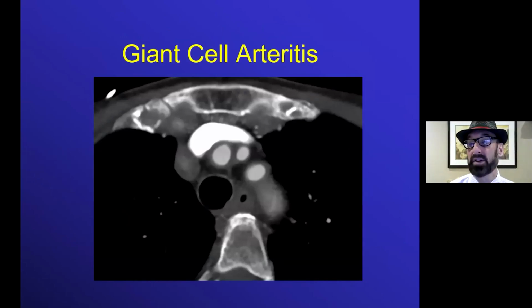The second of the large vessel vasculitides that was described is the giant cell arteritis. Again, we usually don't see that intracranially. That's more commonly seen around the blood vessels as the takeoff from the aorta, for example, and elsewhere in the body. In this case, the abnormality is the degree of wall thickening that you see around the enhancing lumen on this CTA.